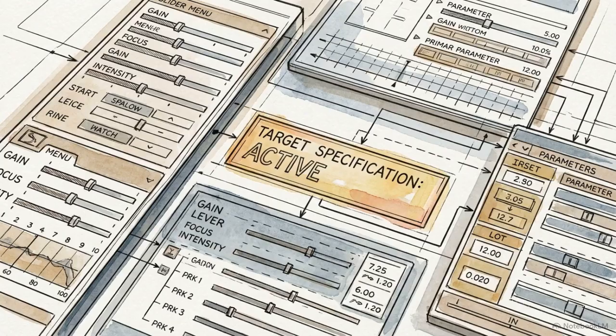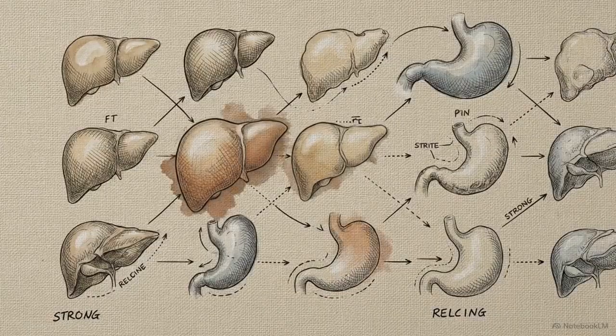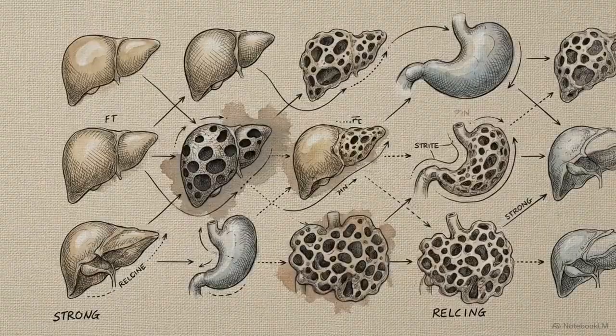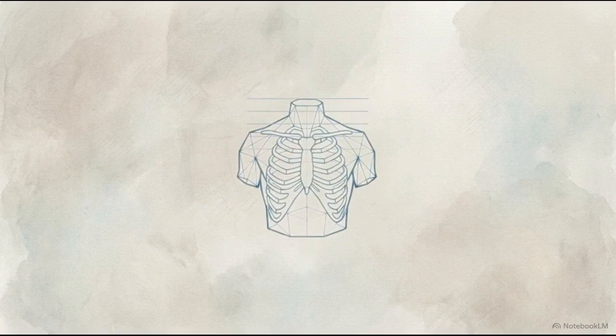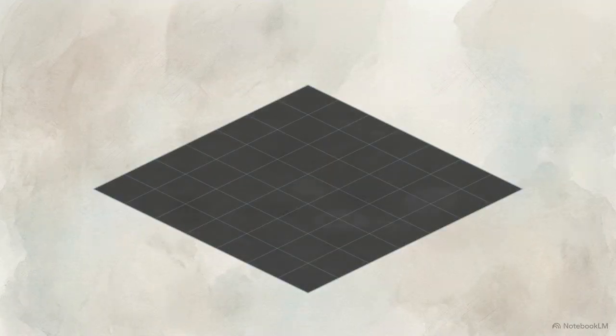Text prompts are dynamically assembled, like porcine brain within the skull, to guide the model in generating specific tissue textures and densities. This hybrid approach creates anatomically realistic variations in organ geometry and X-ray density, all without ever scanning a real patient. Strictly controlling this synthetic anatomical canvas provides the exact foundational variability needed for robust model training while circumventing patient privacy constraints entirely. Phase 2 integrates miniature medical devices into this newly generated synthetic tissue.